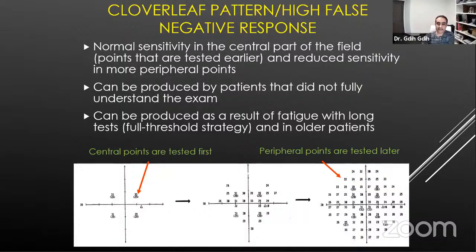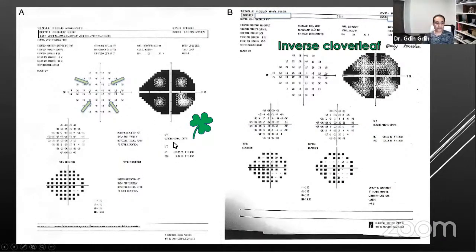So this is how the clover leaf pattern forms. Now, just a bit of background about clover leaf. It's believed that the clover leaf with the 4 leaves is the one for luck.